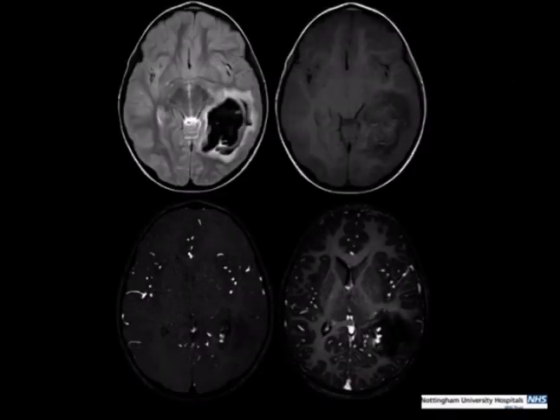This is another one, just to talk a bit about using MR. Obviously, we try not to use CT over and over again for looking at intracranial hemorrhage or possible causes in children, if possible. This is a child with a temporal lobe hematoma this time, and we've just been lucky. We've managed to scan him early, so we've got low signal on the T2, but still pretty low signal on the T1, or isointense signal. So this is blood in its deoxyhemoglobin state before you get this T1 hyperintensity.